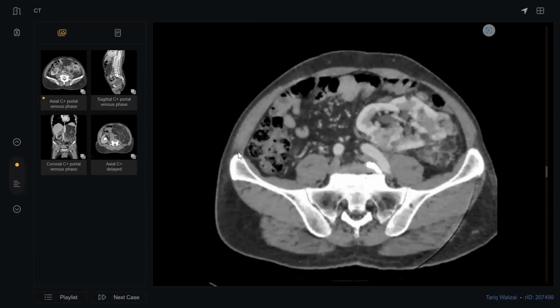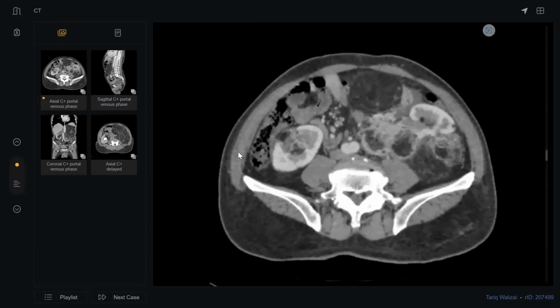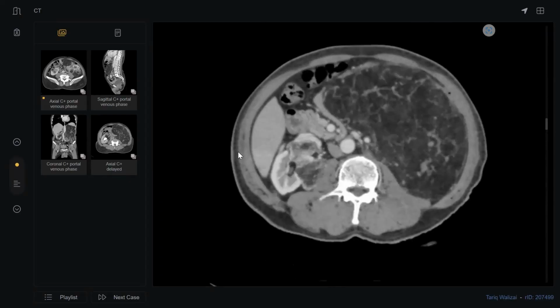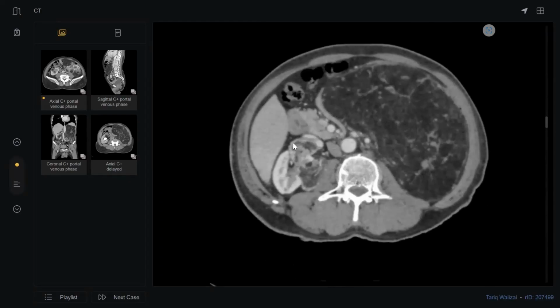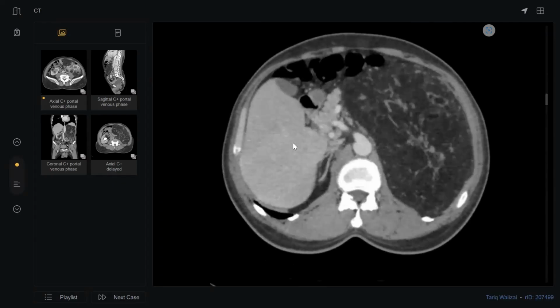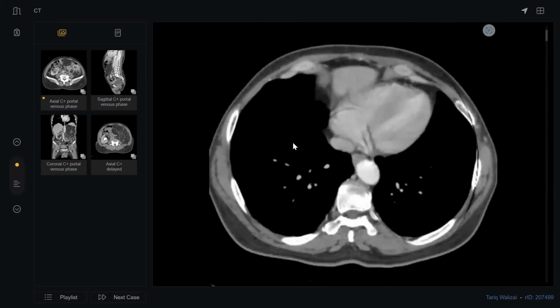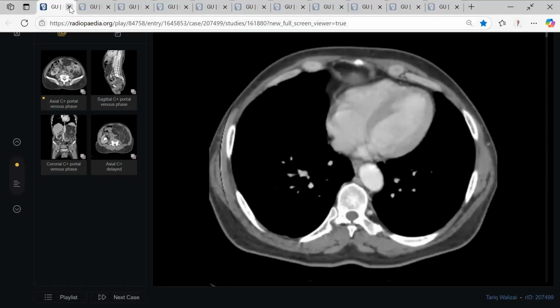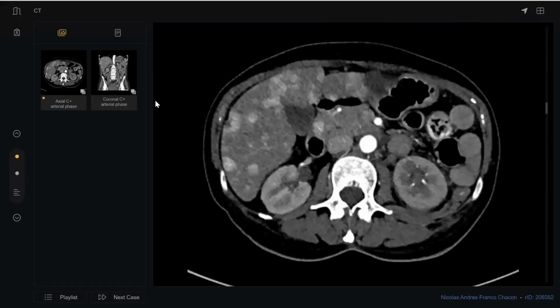The patient should have undergone an MRI. You can also tell the examiner, doctor, I didn't see any ventriculoperitoneal shunt. This is a very good sign from you. However, I wanted to either revise his previous images or do screening.